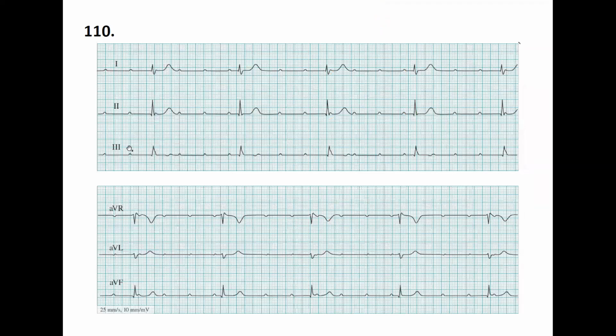Number 110. Yes, that's me. Okay. So it appears to be rhythmic. There's quite a few blocks on this one. I counted them as 10. So if I divided by 300, that would be 30 beats per minute. Good, very good. So it's bradycardic.